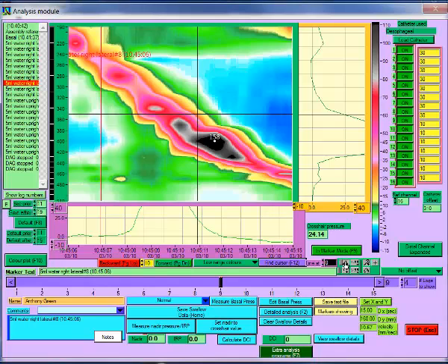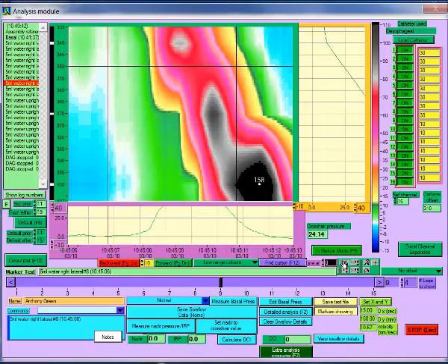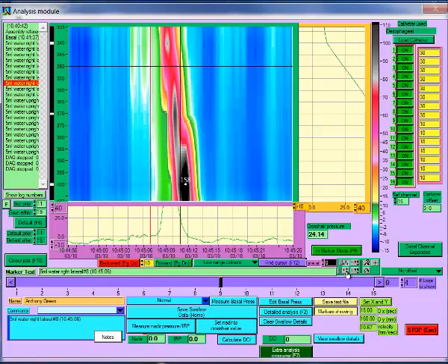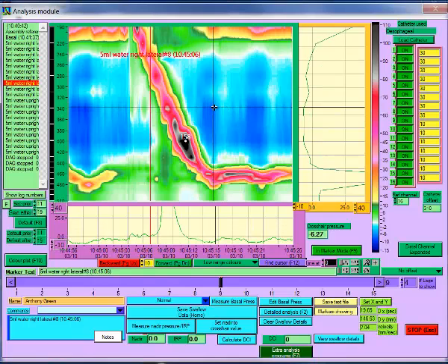Clicking on the box at the left-hand end of the control reloads the original data. Be sure to select the cursor control after you have finished with the expansion control so that you can move the crosshairs again.